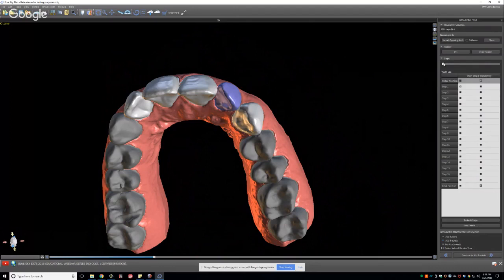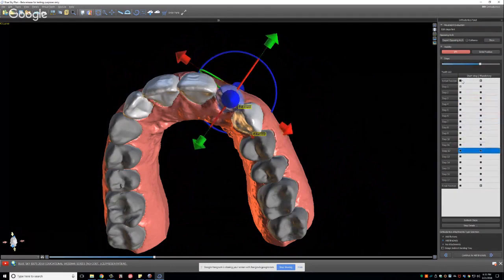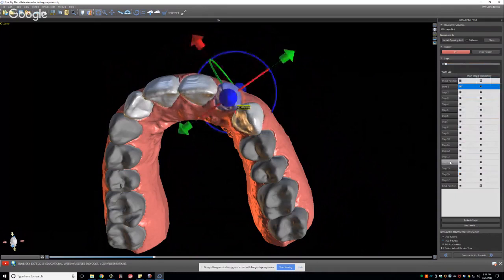What is necessary, however, is if we turn on the IPR and we watch this, you'll notice that it gets into a significant IPR range, 0.98, almost a millimeter, before it continues on to its final position, at which there's just 0.3. Okay, so how do we avoid that? We don't want that to occur.